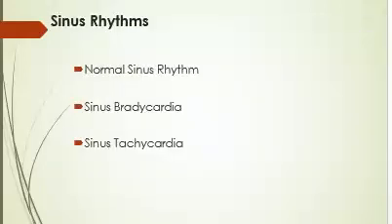So today we're going to discuss sinus rhythms. When I say a rhythm is sinus, that means it has a P wave. The electrical impulse came from the sinoatrial node. Normal sinus rhythm, sinus bradycardia, and sinus tachycardia. So let's talk about sinus rhythms.